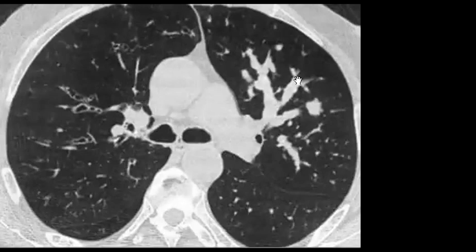They like to mention something called fleeting alveolar infiltration. Fleeting, like migrating, that it appears in one chest radiograph, then after, for example, 2 weeks or 3 weeks, it disappears and moves around to another part of the lung. So that's the importance of mention, and in the management, you need to check previous images to see if this is the eosinophilic type, which is the fleeting alveolar infiltration.